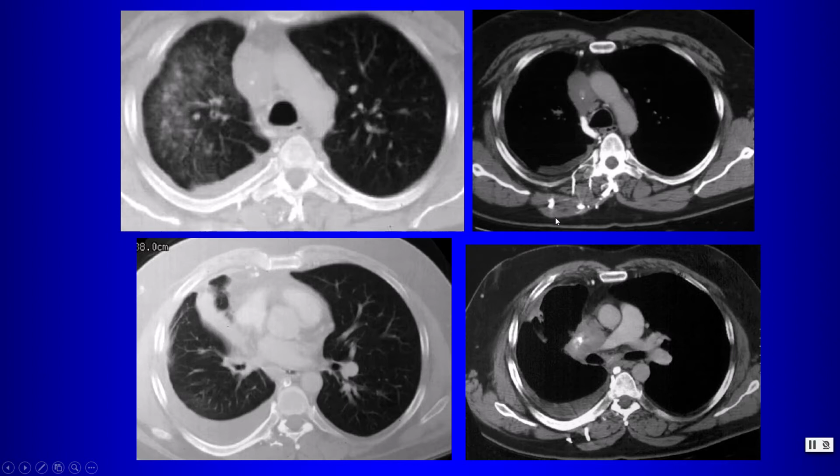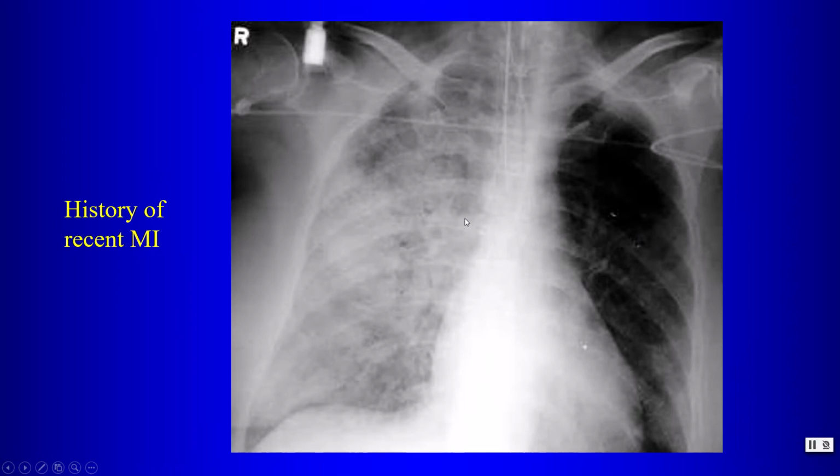And when we look in the mediastinum, we can see that there is this mass here in the mediastinum which contains some calcification. I'll tell you that this is not a malignant lesion. So what benign condition can give you this mass-like appearance of, it turns out, lymph nodes in the mediastinum with calcification and obstruction of the pulmonary vein, and also the superior vena cava in this case? You can see the azygous vein here is dilated and full of undiluted contrast. So what condition can do this? What benign condition? This is fibrosing mediastinitis.